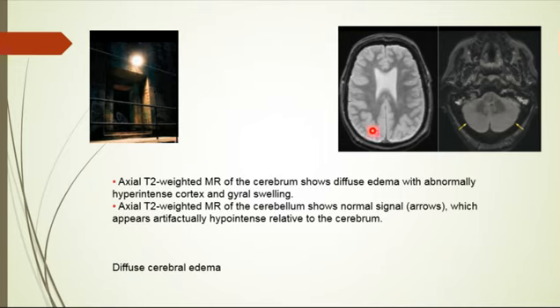You can see it obviously here. I told you this is an adult, not a child. So you have to treat it like we normally see a brain. This is not normal, of course, but the more diffuse the signal abnormality, the more difficult it is to see. And this is the normal cerebellum. This is the normal pattern that we usually see. So this looks dark relative to this.